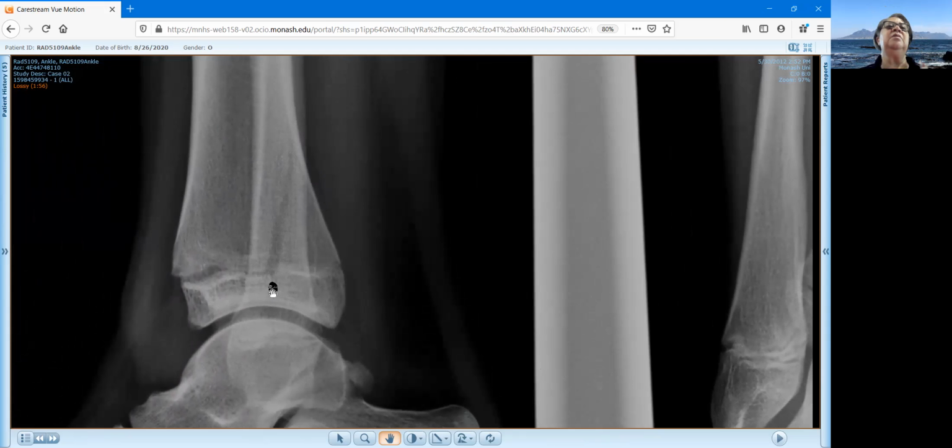So basically we are looking at a fracture appearance that could either be a Salter-Harris type 2, or it could be a Salter-Harris type 4, because that fracture line has gone through the epiphyseal plate and is lower than the epiphyseal plate. Now, the report on this one was that the radiologist was unsure whether it is a true Salter-Harris type 4, and the patient was, of course, referred for a CT scan.